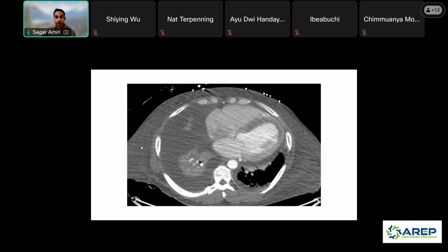They have anasarca, all this edema in the soft tissues. And if you look at the heart, it looks a little big. And then there's also this low attenuation along the subendocardium of the left ventricle. So right there. So the next question is, is this real or not? Well, it appears that they probably have heart failure.